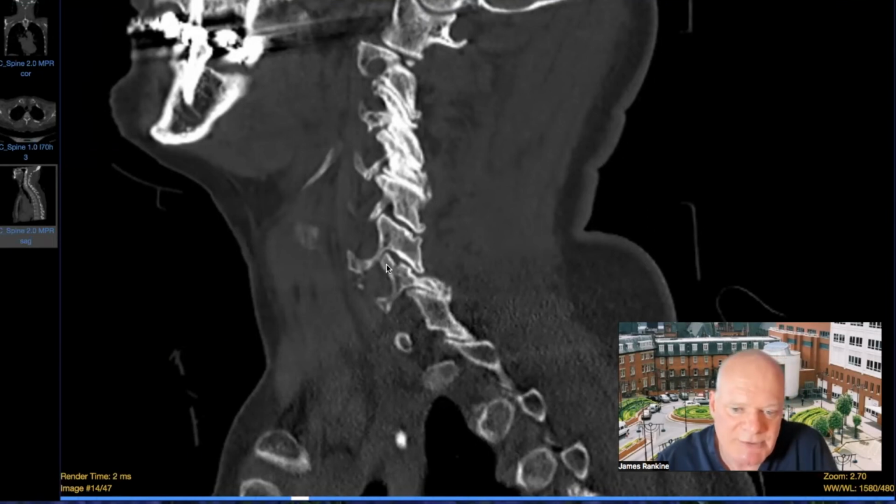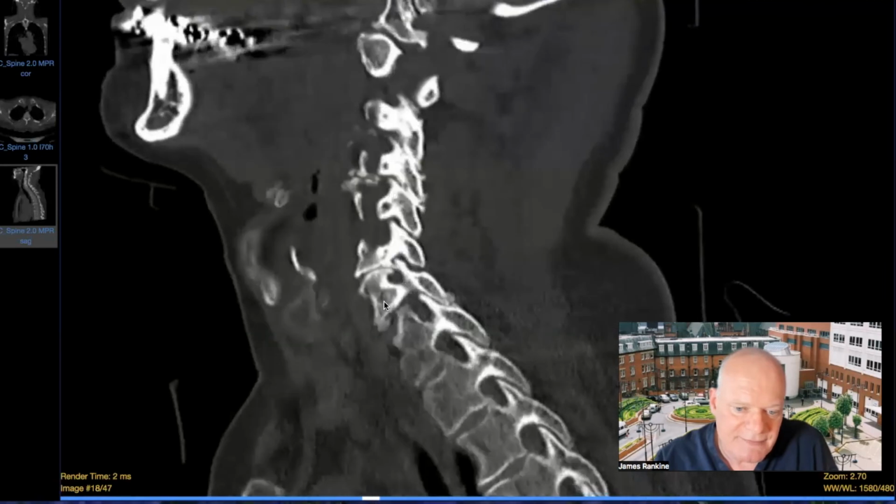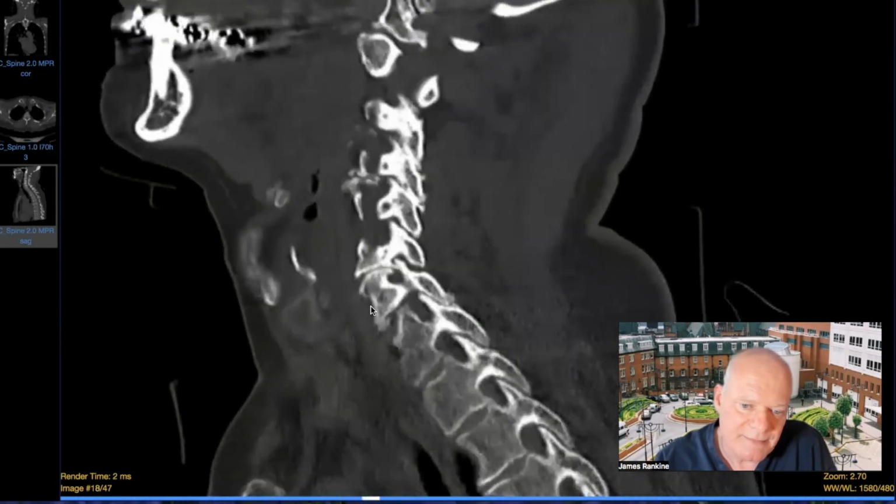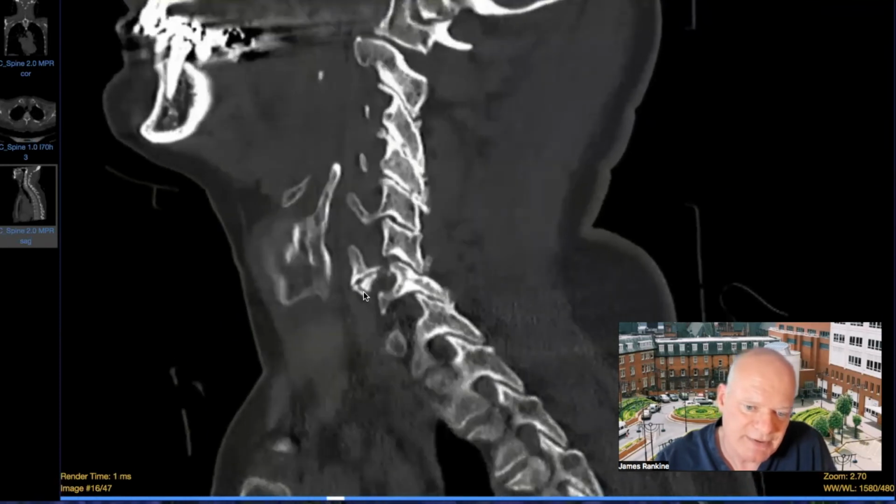What you have to imagine is, how did that fracture actually occur? What position was the spine in at the point where the fracture occurred? You can imagine that this facet joint drove up and then pushed forward, breaking this little portion here. So any horizontally orientated fracture through the facet joint, even little tiny avulsions, capsular avulsions around the facet joint, are very significant, because they're evidence of a flexion injury. And the other sign of an injury here was a compression fracture just here, longitudinally through the anterior aspect of the vertebral body.